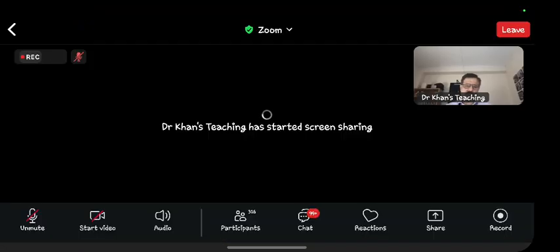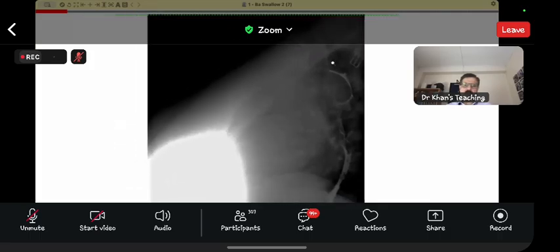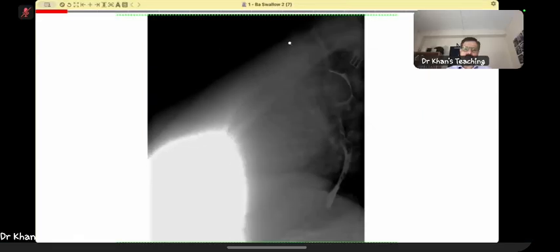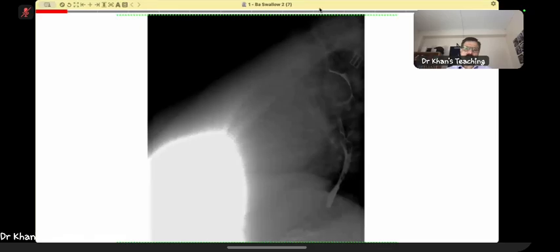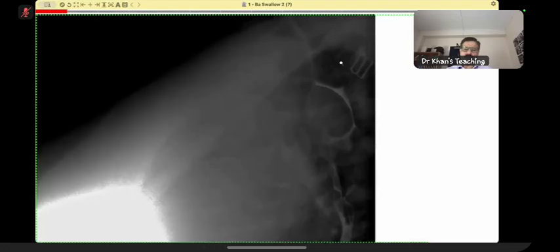Now, bariums, please remember that bariums do come in the exam still. And the current generation, your generation, you are now not doing bariums, so your eyes are not trained for bariums. So this is a barium swallow examination, which gives us a very good addition to whatever we have learned.